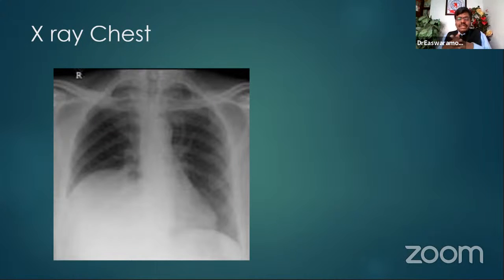All those findings you try to recollect. Like that, here is one patient who came with a 10 days history of fever and pain in the right upper quadrant, a chronic alcoholic. He came, and this is the X-ray chest taken, following which an ultrasound abdomen was also done. Ultrasound abdomen showed a large collection in the liver. I'll ask if Jagan is happy to give the answer. Try at least from the background information I said. Yes, Jagan.